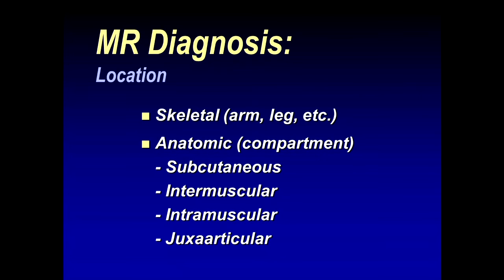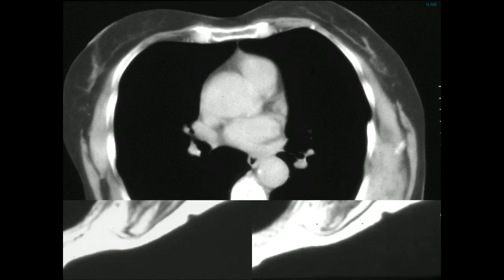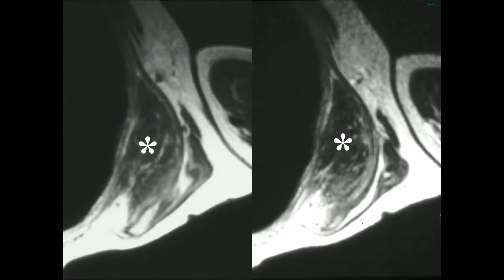By way of example, this elastofibroma with its crescentic shape and classic location below the tip of the scapula, and we can see it on MR imaging with its well-known fibrous component showing lower signal intensity, similar to that of muscle on T1 and T2 weighted images, with some encased strandy fat within it, very characteristic of an elastofibroma.